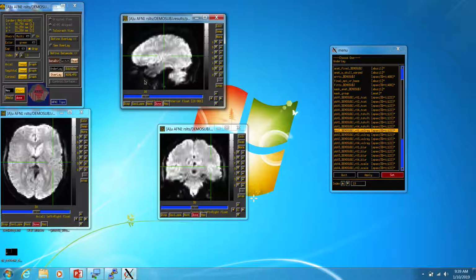The template space, again, letting us compare subjects to each other. So if you run through the step with a lot of subjects, everybody's kind of in the same common space. And so when we talk about a particular voxel in here, we're talking about a particular area that's been mapped out. We applied a nonlinear warp, so you'll notice too that there's variation. The linear warps just kind of move the brain around to help match it better.